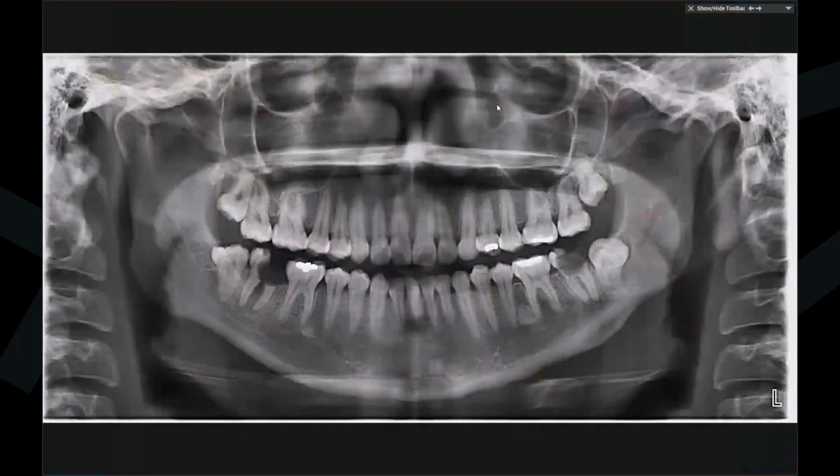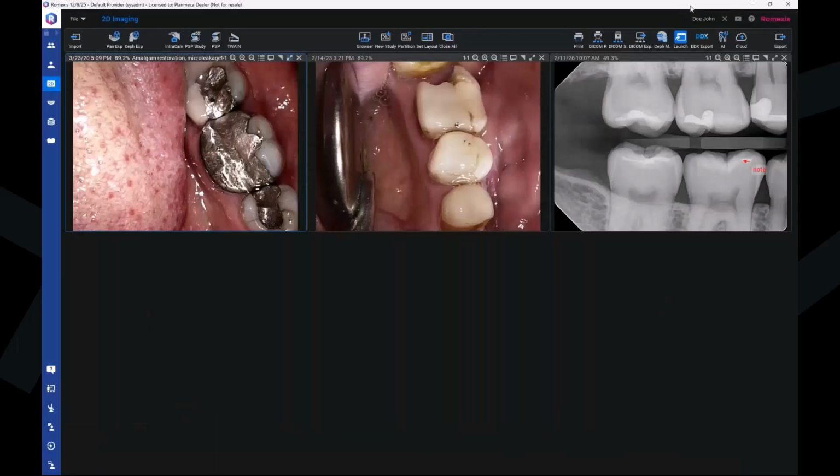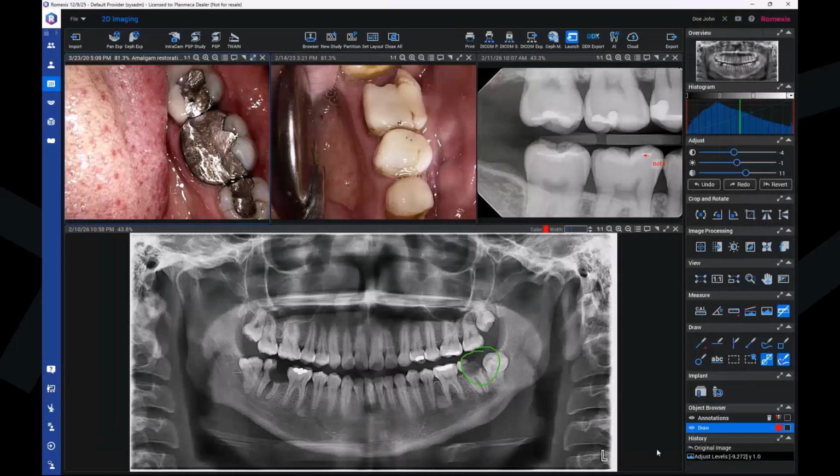And if you want to do some measurements or annotations here, you could just open the toolbar from here, do the annotations if you wish, and then get back just like that. So a lot of possibilities here to maximize the images and the screen.